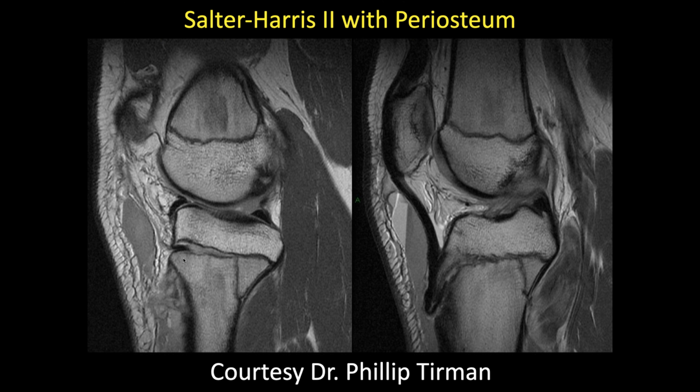I think age may be important if you're really concerned about this. The older the patient, the less reason to think about surgery. But in this area, I don't think I'd want to stick my knife in there and start mucking around with the epiphyseal plate. This is the tubercle region, and that can prematurely close it. It's difficult to work with the tubercle.